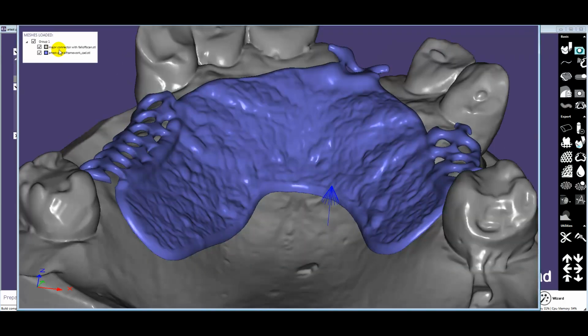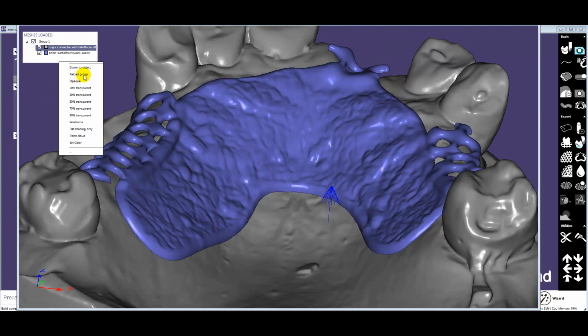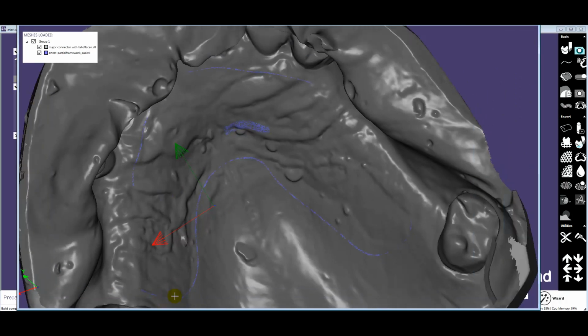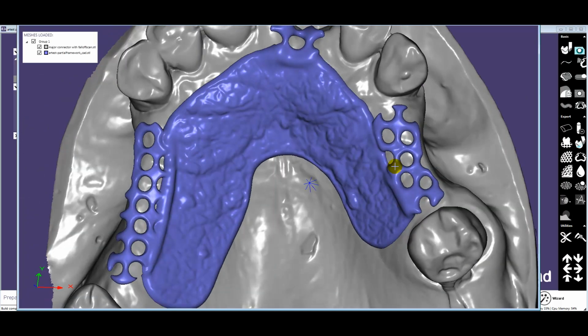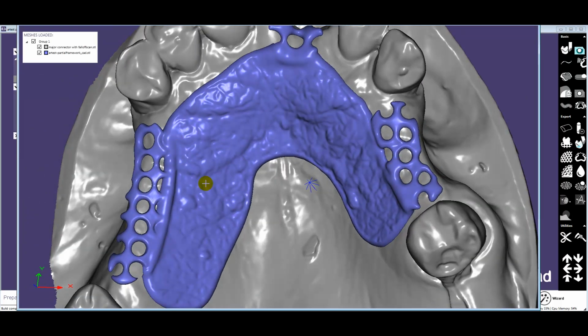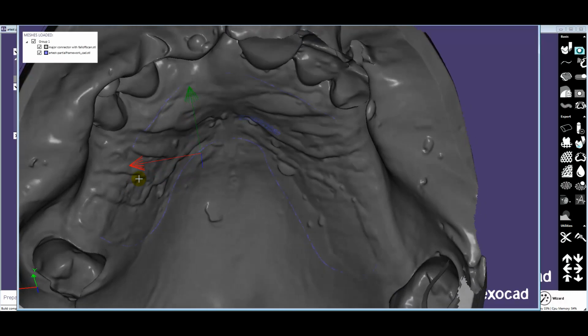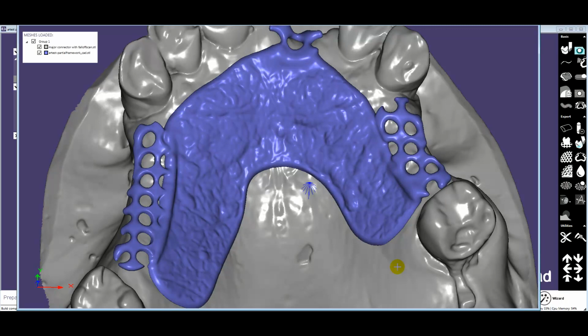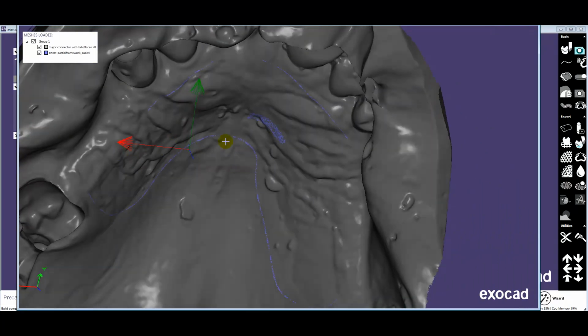So I can just go over here and reload. And okay, so you can see now this edge. It's not doing the edge where it overlaps with the mesh. It's something we could consider adding if you want it. Right now I only look for the edge of the major connector where it's not connected to anything else, so sort of the outer exposed edge. And then I apply that little bit of fall off there. You can, of course, also change these settings.